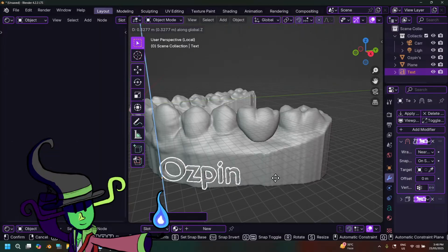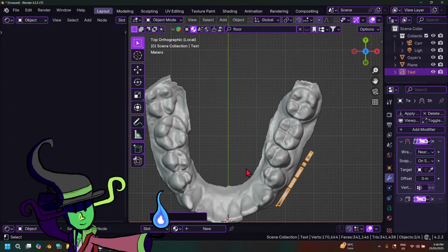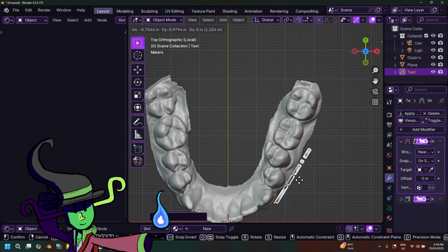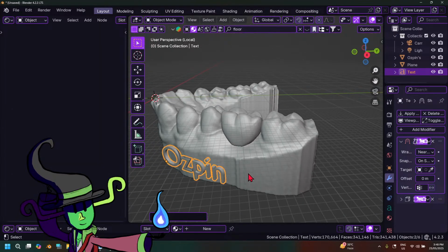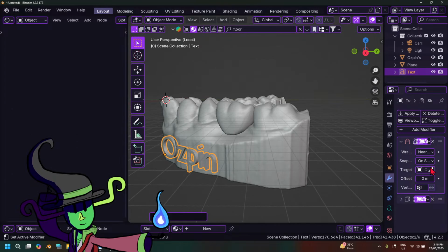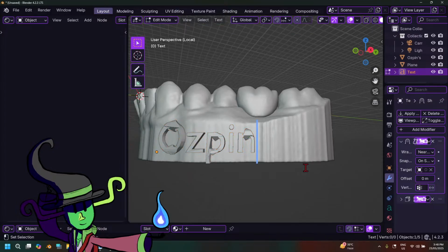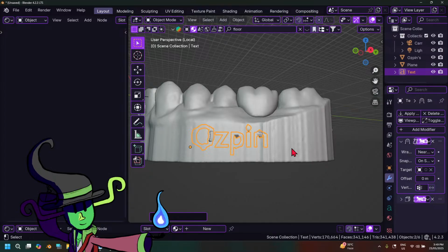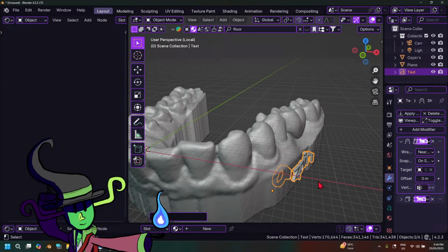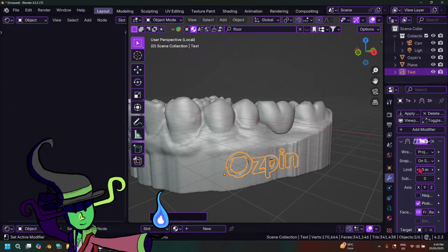All right. I think it's best if I did this with my closed model. Yeah, maybe I should do my closed model. Wait. Actually, wait, before I do that, I want to see if this works with the project. Okay.